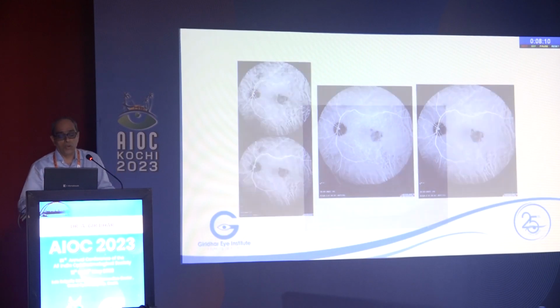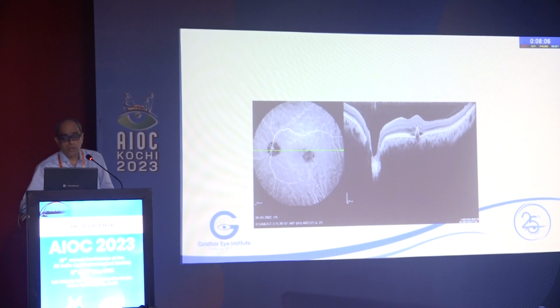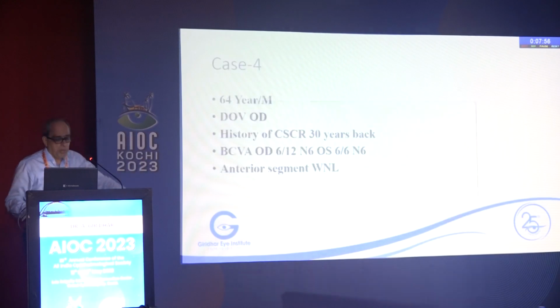Therefore, using multimodal imaging in this particular patient, we diagnose it. You can see beautifully now, this is a classic picture, which beautiful pictures already Dr. Anand Rajendran has shown based on our work that we did many years together. So you can see that tall peak PED there.